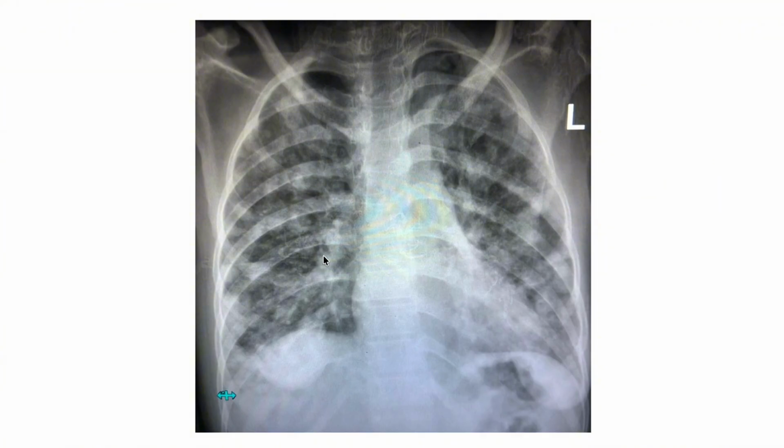Quickly. And for me, when I quickly look at a dirty chest, if I can call it a dirty chest, with so many infiltrates, reticulolinear, they are a mixture, they are linear, and also they are nodular, especially in the periphery, then I want to conclude that this is probably a metastatic process. Again, secondarily infected, probably with a pneumonia. These are all my conclusions.